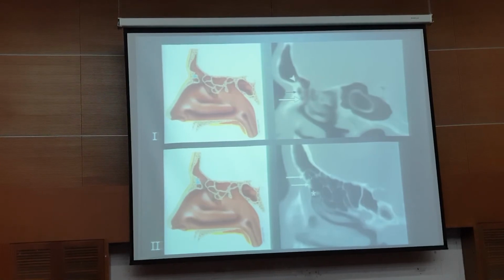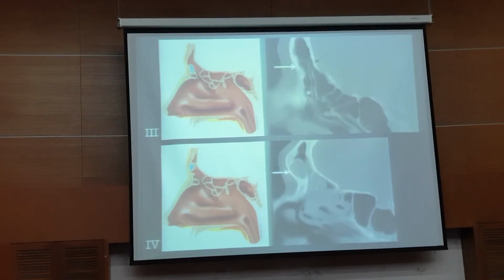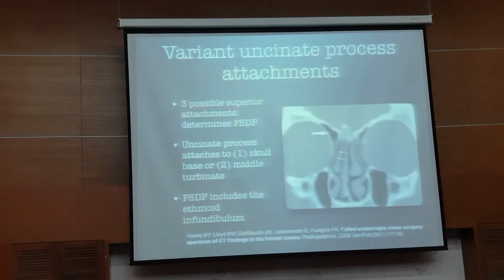If it's a bit larger, or if there is more than one, it is type 2, I believe. If it's somewhat encroaching into the frontal sinus, it's type 3. And if it's mostly located inside the sinus, then it is a type 4. You can see how much disease it can result in.